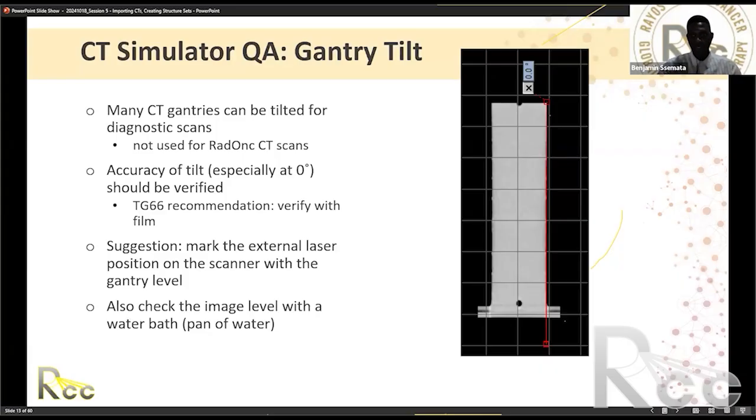Douglas. Yes. Yes, there is a question in the chat from Suresh. Does using the artifact reduction change the Hounsfield unit of the normal structure or not?